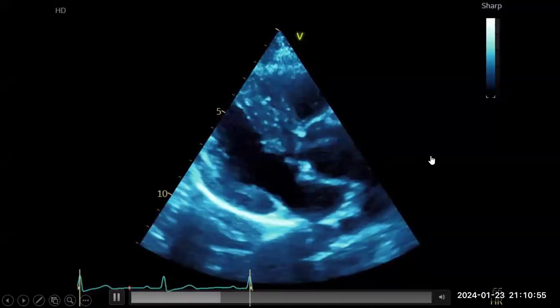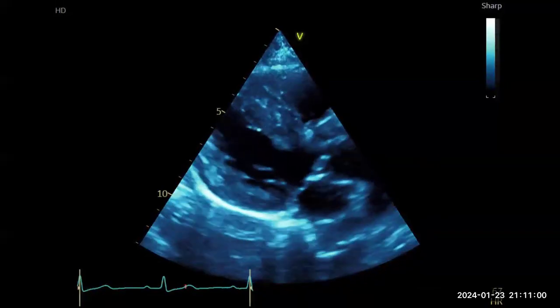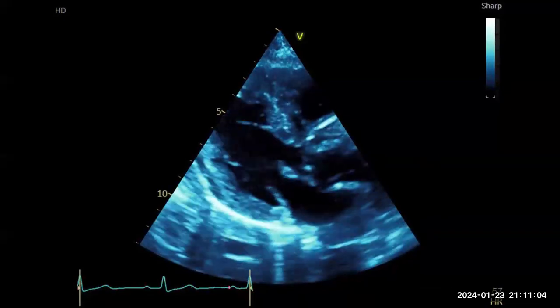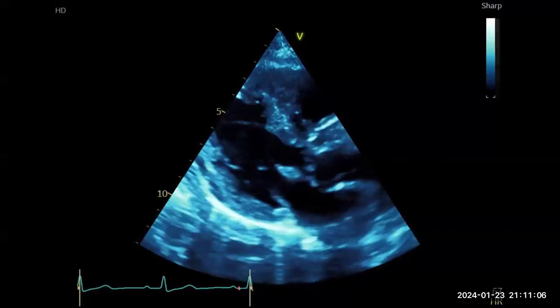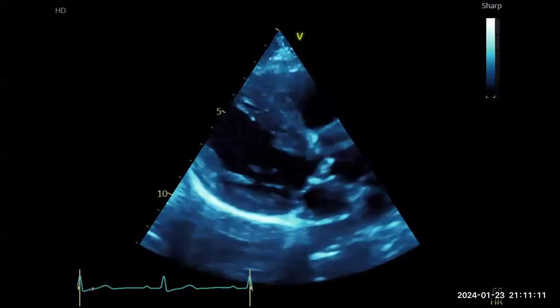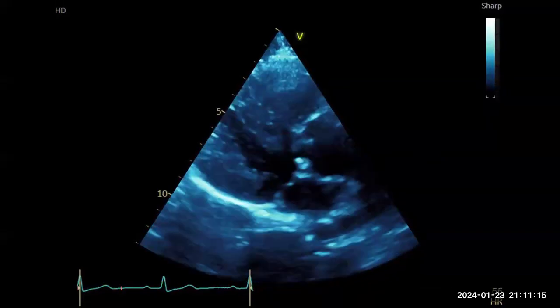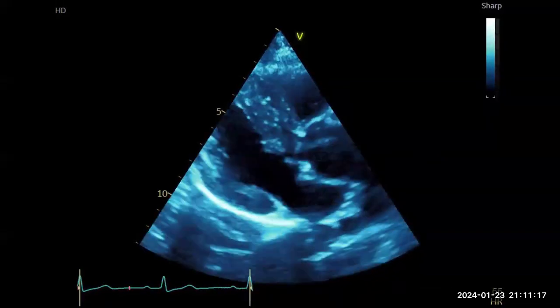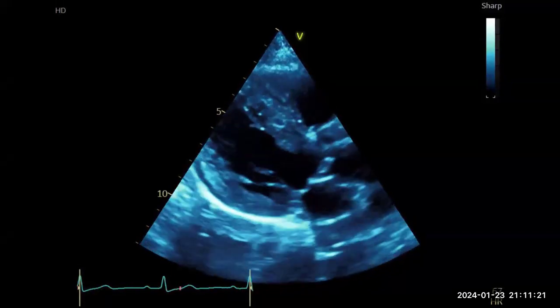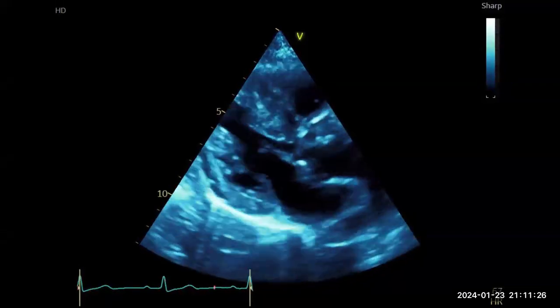So I'm looking at a long axis parasternal view, and it seems that the LV walls are thick and there's some degeneration, or at least the aortic valve looks like it's thickened, but opening well. The mitral valve annulus probably has some mitral annular calcification, and there's a bright pericardium on the posterior side. The atrial size looks okay. The RVOT looks okay. And I'd like to see more views.